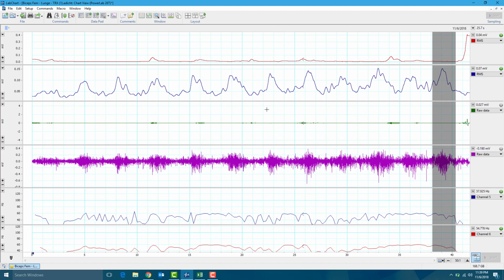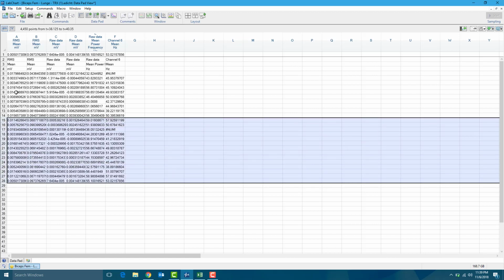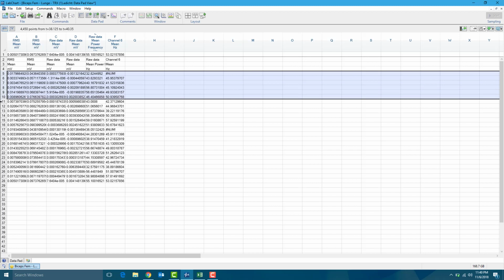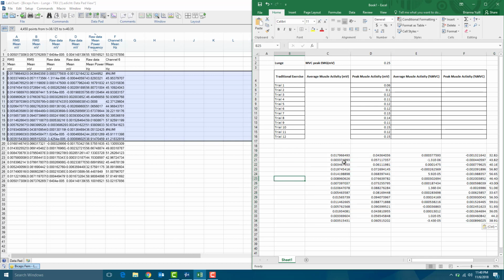So once I've added all those to the datapad, I switch from my scope view or chart view, which is what I'm on now. So if I click that, it doesn't take me anywhere. But if I click on this datapad view here, that will take me to the datapad. Now you can see I've got 28 lines of data here. I was playing around with some of the data earlier, but my first 12 should be exactly the same. And I'm going to grab that, roughly the amount that I had. You can count that later, and I'm going to copy and paste that into Excel.